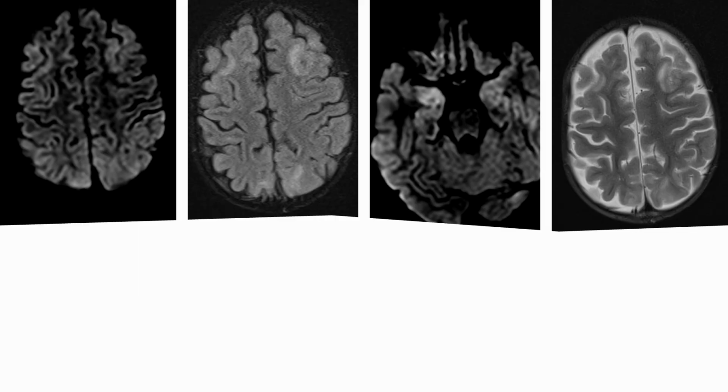This is a companion case of an 8-year-old who was admitted post bone marrow transplant for an underlying hematological condition, and essentially was experiencing some altered neurology with reducing GCS. The team were concerned of an underlying bleed, potentially an infarct. They also recorded some EEG epileptogenic activity, and the MRI revealed that there were bilateral regions of T2 FLAIR hyperintensity, which were along the internal watershed or border zone region.